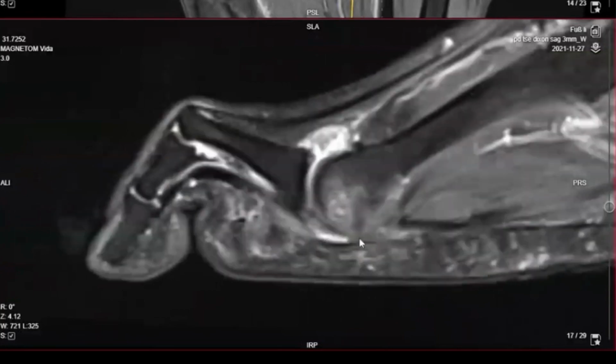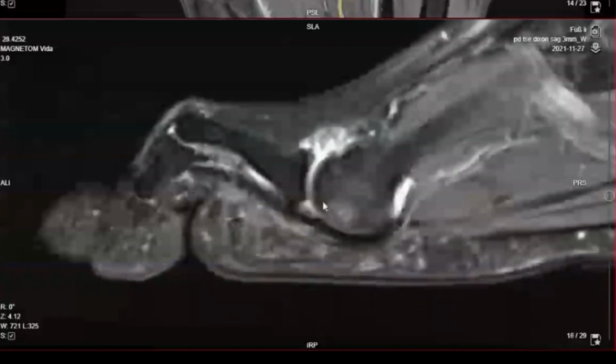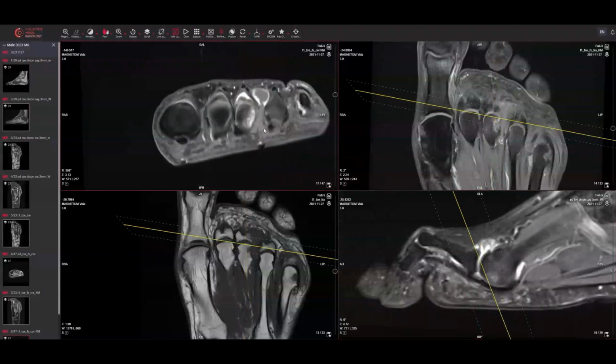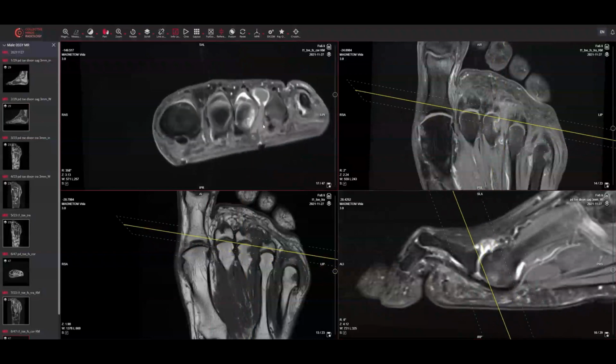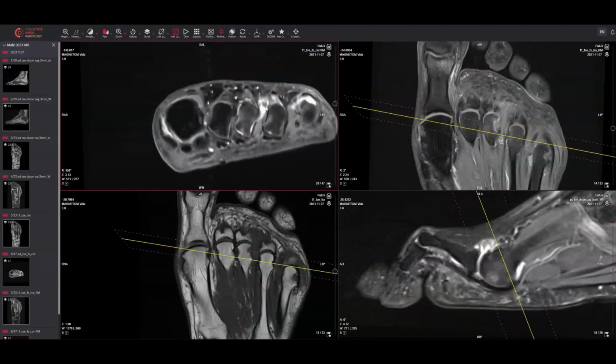And you can see on the sagittal images just how thinned out and torn this plate is and the stress-related edema that's occurring in the metatarsal head. Also notice the exaggerated joint effusion and the cartilage loss in this location. So pseudoneuromas and neuromas do have a crossover, especially when they're this large. This one causing certainly probably a degree of pain and mass effect, exacerbating the erosion and altered biomechanics. I'm certain that the patient probably experiences a click.